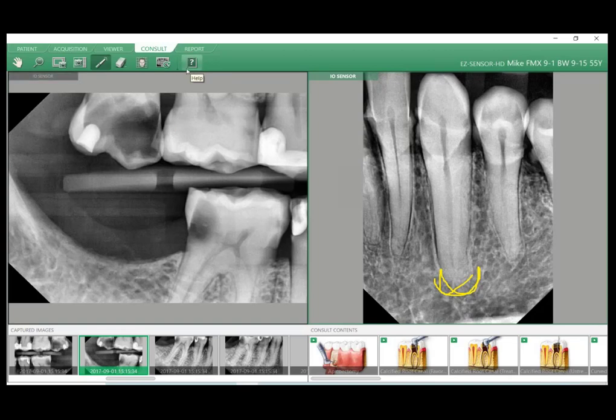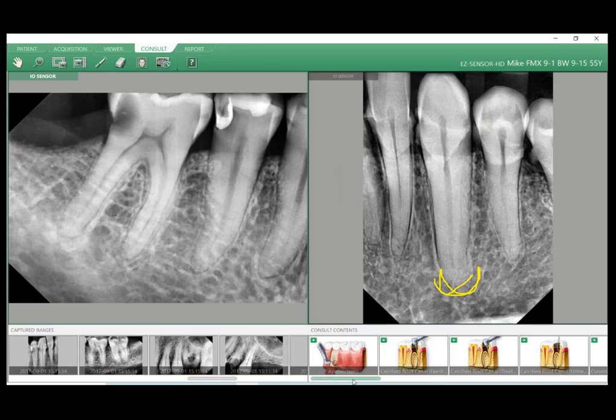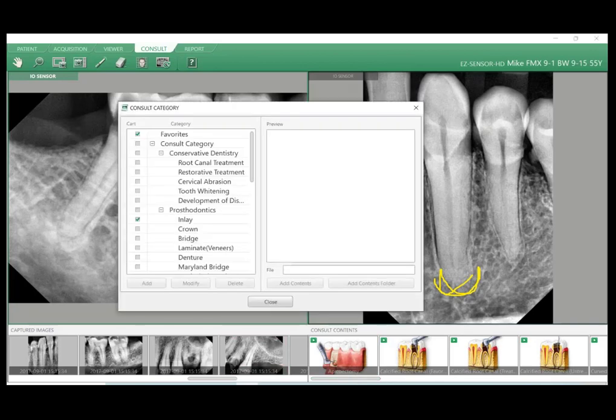And then lastly, one thing that you can do in here, which I've set up a few times for offices, is create your own custom consultation video. I've had a couple doctors that have filmed their own consultation videos with real patients of procedures and things like that. And if you want to import them in here, you can go to edit down here. I won't go into the whole thing, but you can add your own categories and then import your own videos. So if you film them in an MP4 format, you can insert them in there and just play them just like these ones. So that's pretty cool.